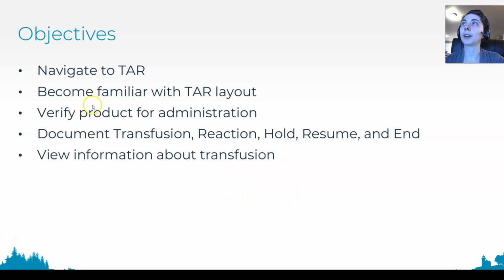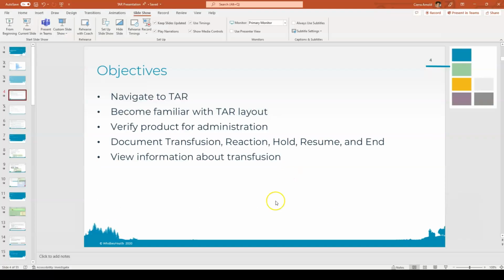So our objectives are to navigate the TAR, become familiar with the TAR layout, verify product for administration, document transfusion, reaction, hold, resume, and end transfusion, and view information about the transfusion. So we'll go ahead and get started.